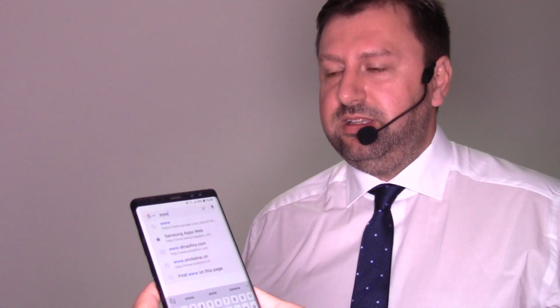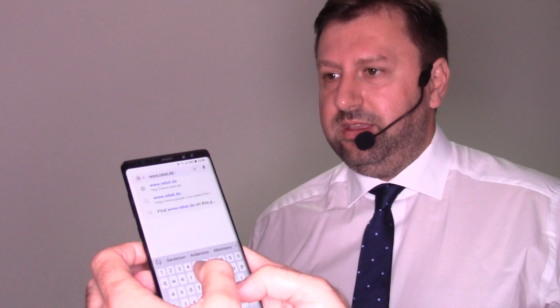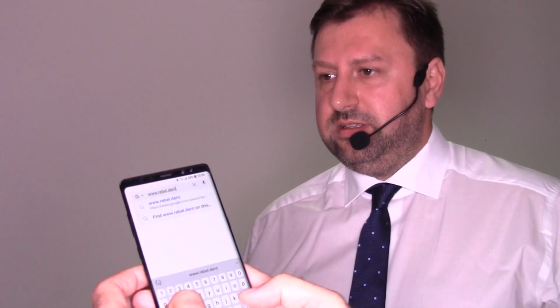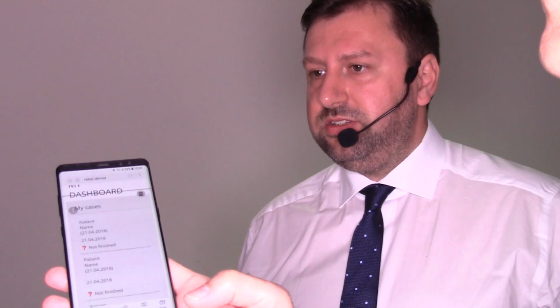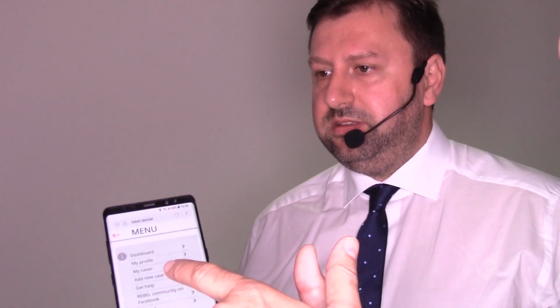Yes, we are on www.rebel.dental. You just log in, and you will see the first page. You can see your dashboard because you're already logged in. And you start a new case.